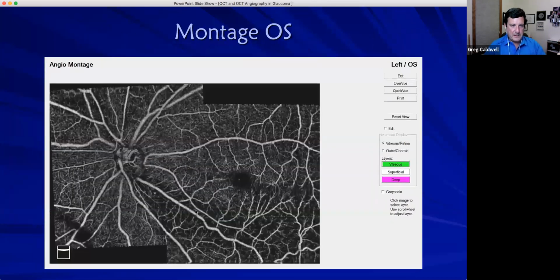And then this would be the left eye here, and this is the eye that's a little bit worse, right? So remember how wide it was, more obvious. And I like this because it reminds us what that scan around the optic nerve is looking at, picking up this area, and how this arcuates around to pick up that ganglion cell measurement.